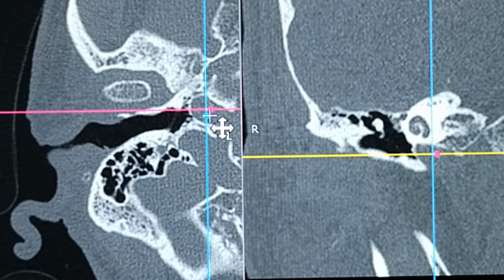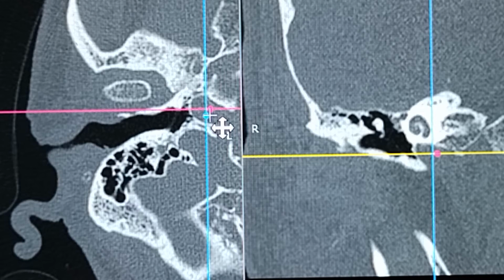Now, this is very, very important. In my previous videos, I have explained the entire course of the internal carotid artery, right from its origin in the neck, from the aorta, basically going up to the termination as the ACA and the MCA. So I'll post a link of that video. You can go and have a look at the entire course of the carotid.